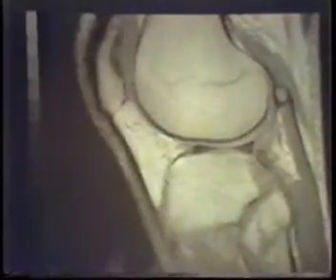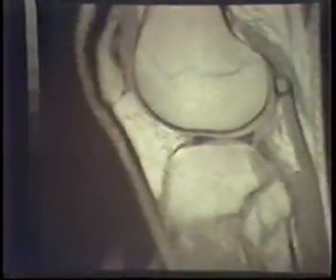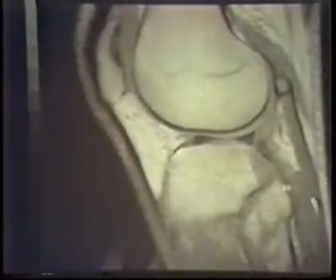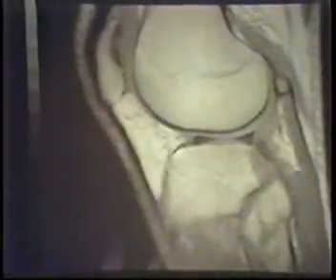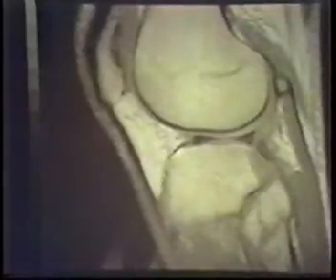Now, I'm only going to touch on a couple that I think are especially important of a lot of miscellaneous conditions around the knee. This is a person who has a fibular fracture from skiing, and this could be seen very nicely with plain films and everything else. And you can see separation of the joint space. On the other side, the patient ruptured the lateral collateral ligament, and the fibular head was all right. This patient, however, had a totally normal plain film.